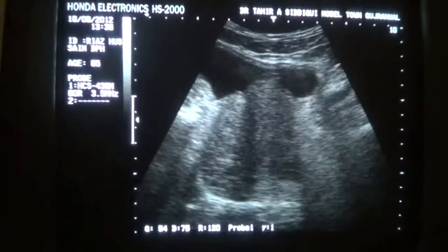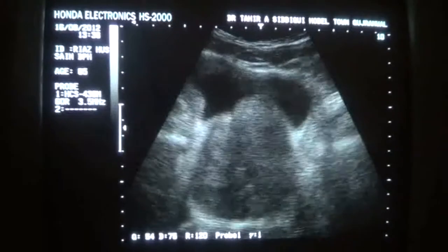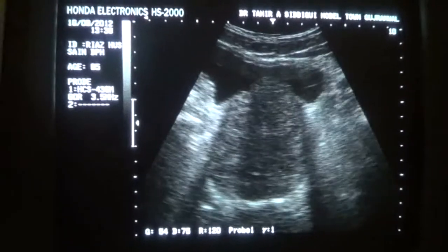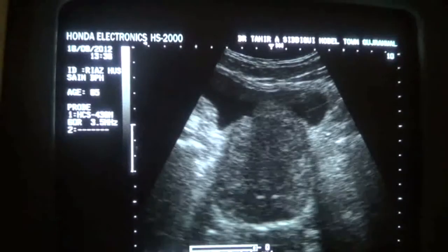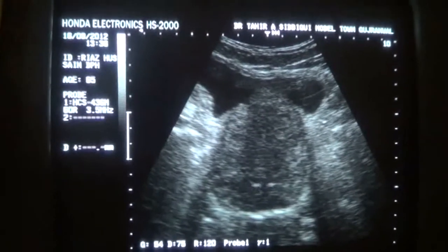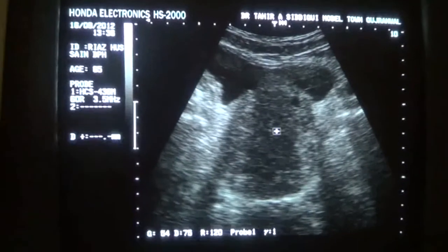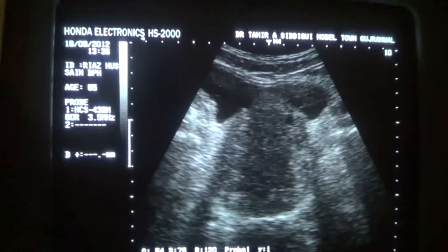Very rarely you come across such an enlarged prostate with tiny calcifications as well as a few cystic areas within it.